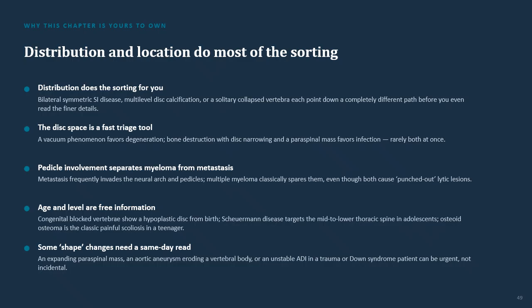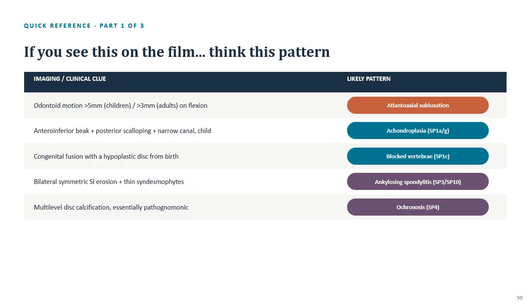So again, we're not trying to memorize all of these, just looking for patterns so that when we get an x-ray and it looks abnormal, we'll be able to identify not necessarily the process, but that, oh, that doesn't look right, that doesn't look normal. So we might be able to hurry the patient along to their next, maybe advanced imaging, that they might need for their diagnosis. We're looking at our quick recognition slides, and this is the first of 3 of them.